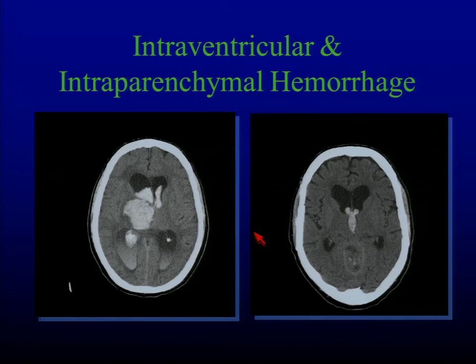Other places, so we're still on that B, but we'll move on shortly from the B, and from blood can be very bad. I can have blood intraparenchymally, I can have blood intraventricularly. We used to, for some reason, stress about which place we thought it started in order to guide management. It really doesn't matter where it starts because management is the same.